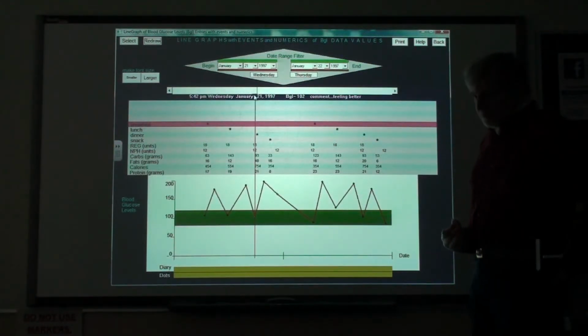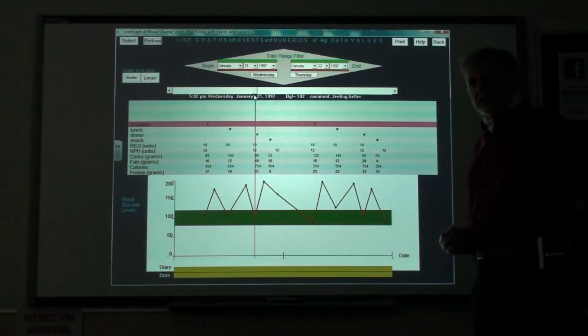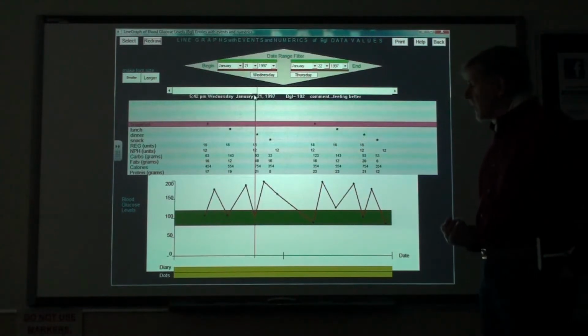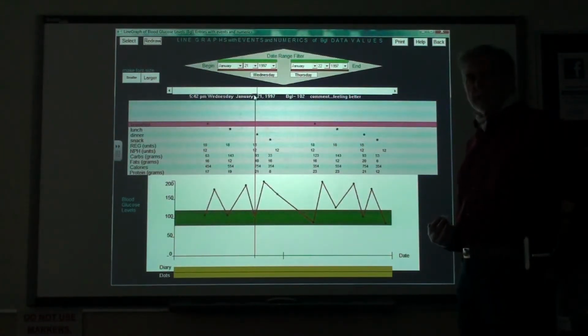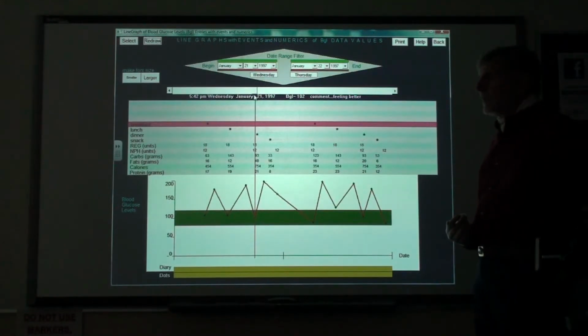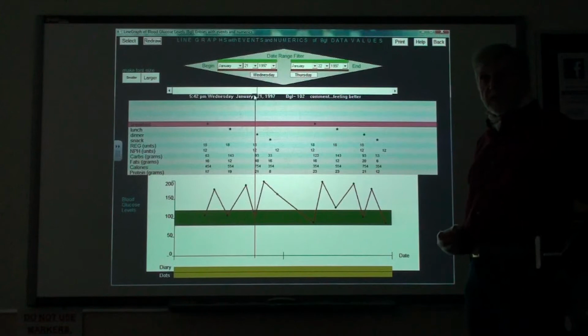This happens, unfortunately, without sometimes understanding as to why it does happen, so an analysis of this type is needed. Also, for a recently diagnosed type 1 diabetic who is learning how to adjust their meals and insulin so as to stay within the target zone, then this graph is also called for at that time.